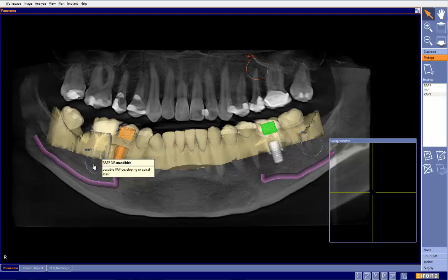And if you notice, as I hover over these findings, my notes pop up here. Just like here it says periapical area number 18 needs endo. Maybe it needs endo, maybe it needs extraction. Whatever it may be, this way we have a legal documentation that we've done something here. So I always like to point that out.